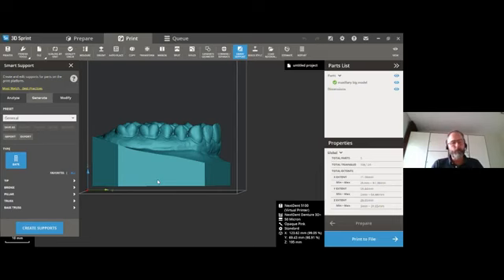Unfortunately, at the moment, there is no possible way to see within 3DSprint whether the part is still printable, yes or no. But we work quite simply with the guidelines that if you follow smart support, adding support is no problem. Replacing support is doable, but removing supports should be kept to a minimum. So only remove supports if they are really in a place where it is not beneficial or against, let's say, our dental design rules.